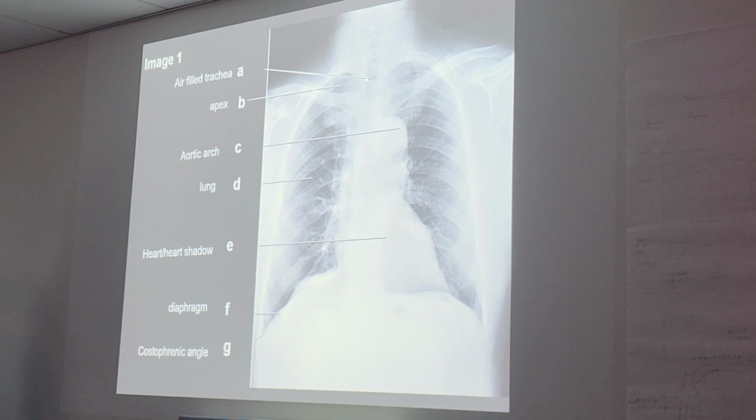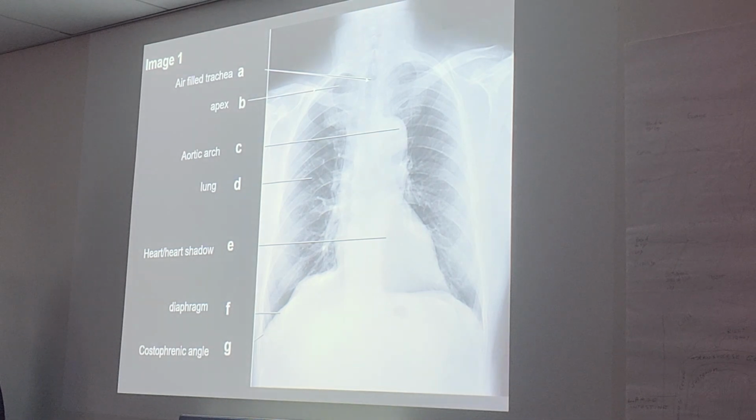How can you differentiate between the diaphragm and the base? If you said base, I wouldn't take off points. Well, I'm gonna put base slash diaphragm. But if you look at the image closely, it's pointing to the space right under the dark area. So the one in the dark would be the base.